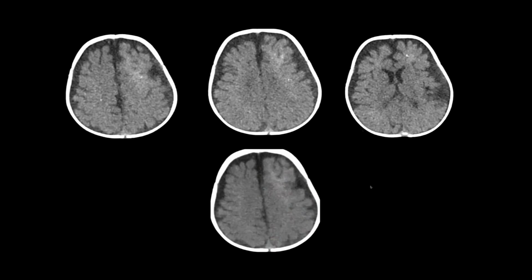I have the CT and MR. So, Ramin, do you want to list out the findings? It is showing effacement and, okay, probably I'll just do it from here.